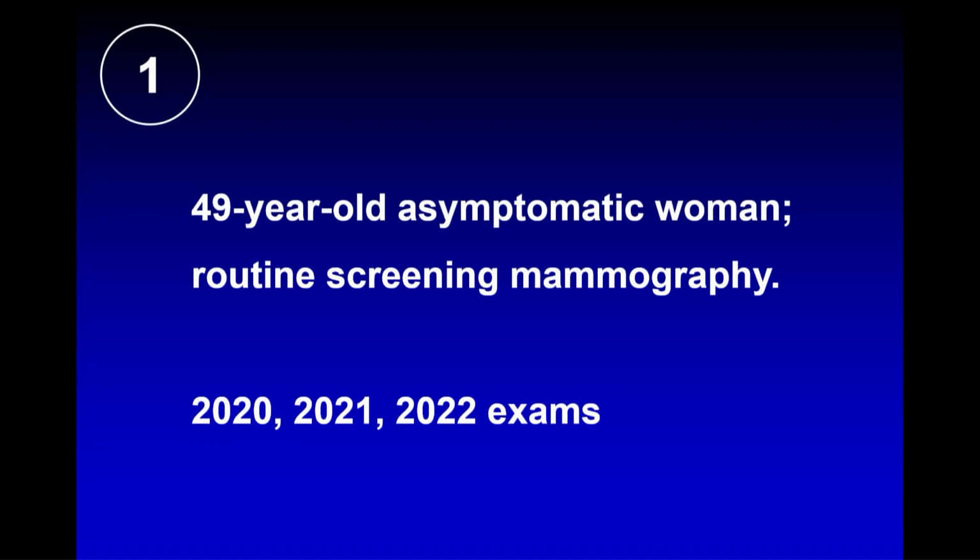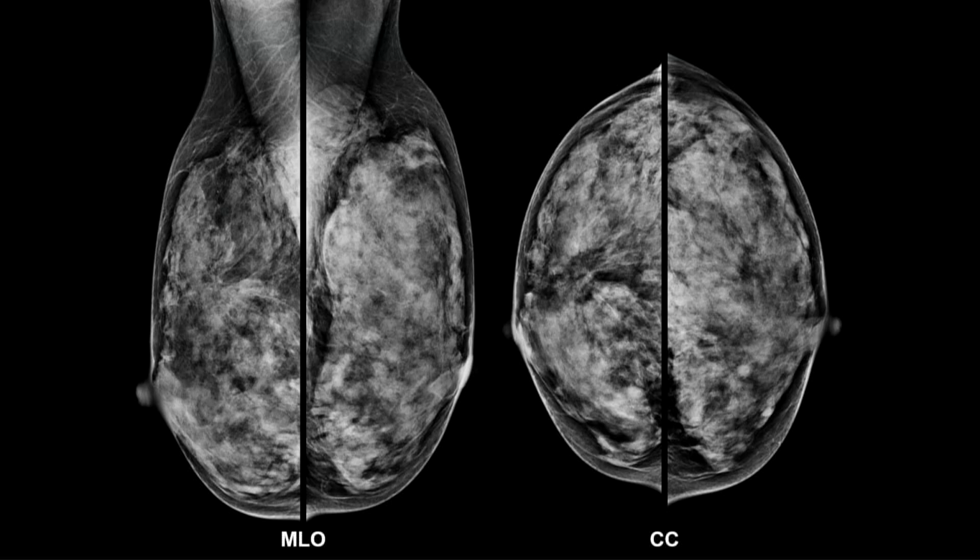The workstations are still there, and you can go back and look. Let's see. I'm hitting the wrong buttons. There we go. Okay, this is the only view you've got of the opposite breast. Which projection? On the MLO, upper central, mid to posterior depth. This? And on CC, kind of central. Here? There's a larger area, that area there.